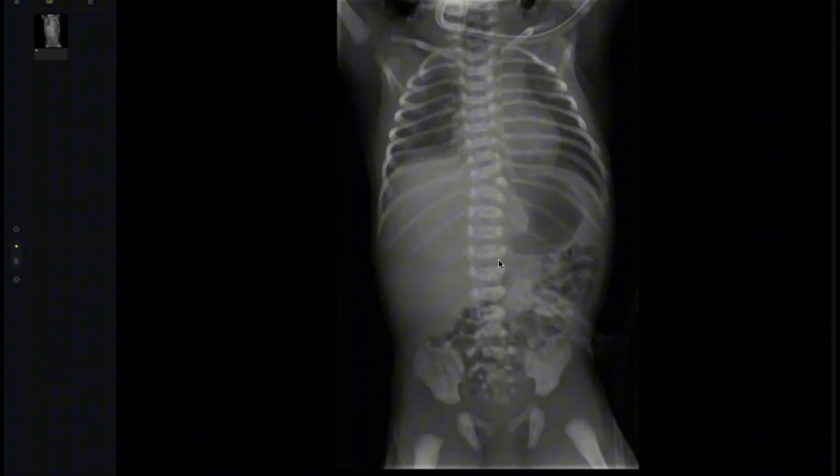Okay, my colleague, in one Viva they gave us out-of-phase and in-phase sequences. So the pathology is almost certainly related to fat. We must program our brain like this. It was bilateral angiomyolipoma, and then the examiner, after discussion, gave us some brain like this. My colleague, this advice every session, I am telling you which pathway I must go through.